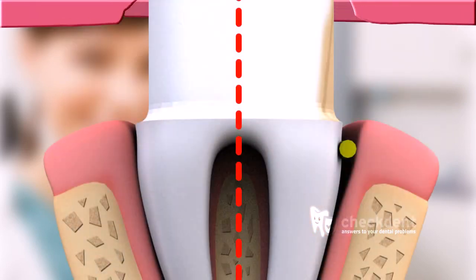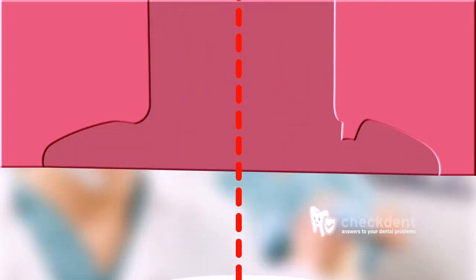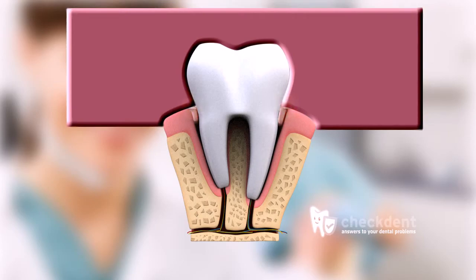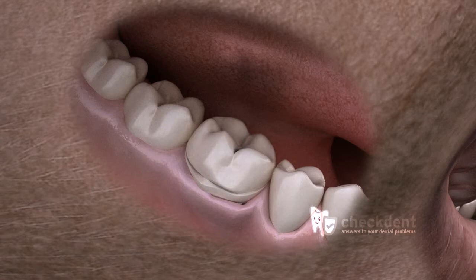margins. On the right of this animation, the preparation margin is clearly visible. On the left, the consequences of not using ligatures can be seen. The plaster mold does not correspond to the prepared tooth as the impression material has not recorded the preparation margins. This could be because of the presence of interfering gingiva and/or blood or saliva. The technician will unknowingly prepare an ill-fitting crown.